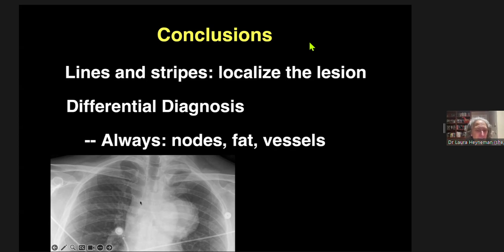If you have a soft tissue mass that's the same density as the wall of the trachea, immediately abutting the trachea, then there is obscuration of the paratracheal line. It's silhouetted out, you don't see it. I think of that as being more common than actual widening of the line. I think the border should be 3 millimeters or less. I don't think I've ever actually measured it.